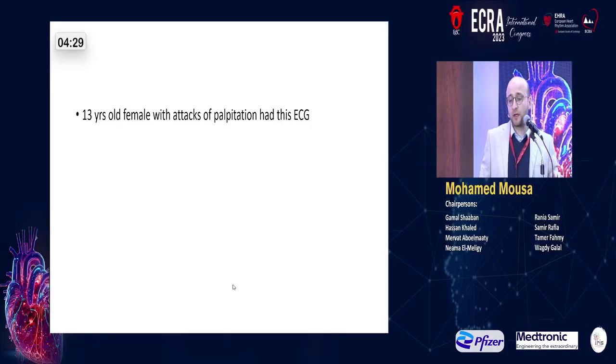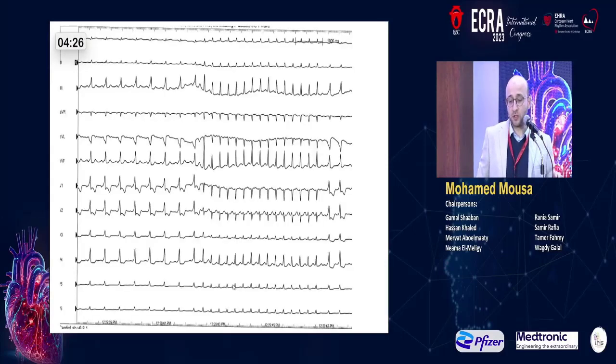A 13-year-old female with attacks of palpitation had this ECG.